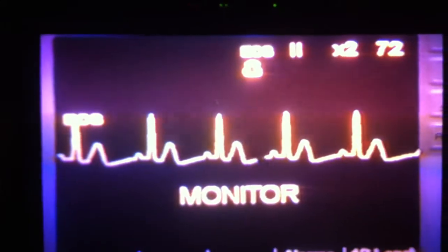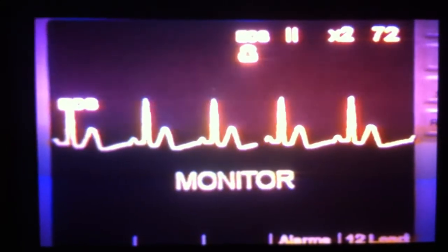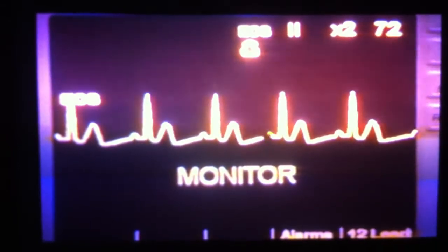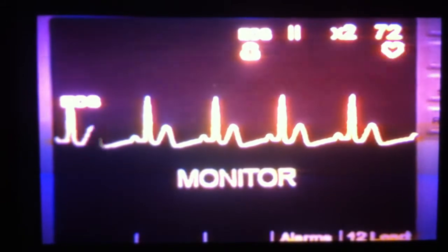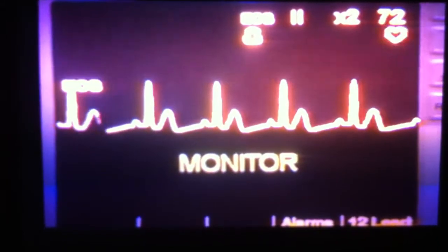Normal cardiac conduction begins when an impulse is initiated within the SA node. The SA node is considered the dominant pacemaker of the heart. Normal sinus rhythm, also called regular sinus rhythm, is considered the normal rhythm for a healthy heart at rest.